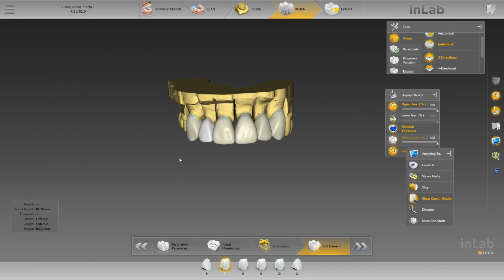Okay, so if you've made it this far in the video, congratulations, because you've pretty much just seen how to make something that is very difficult to design look somewhat decent. Our goal here, given this patient's condition, was to make these teeth look as natural as possible, or in other words, add perfect imperfections.